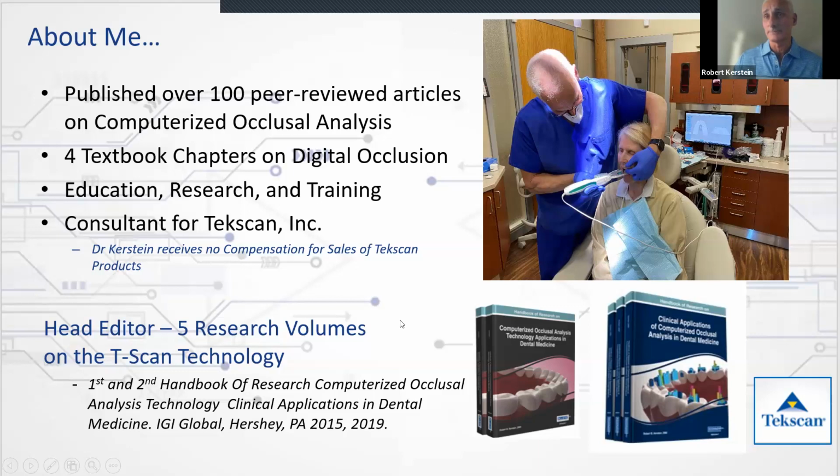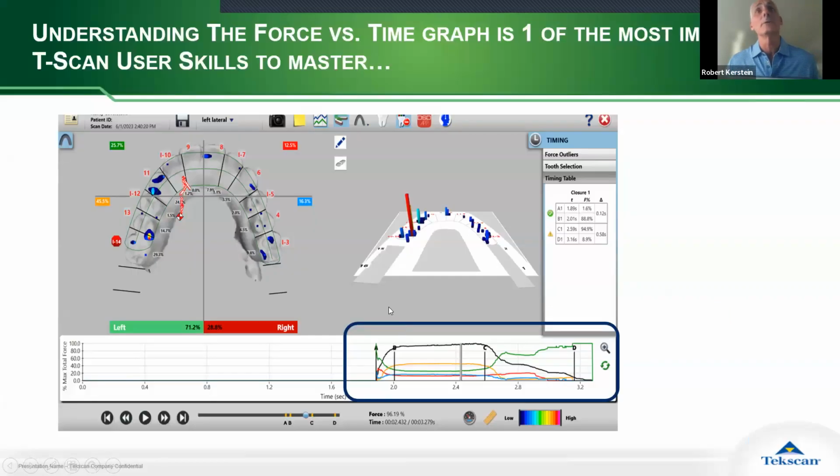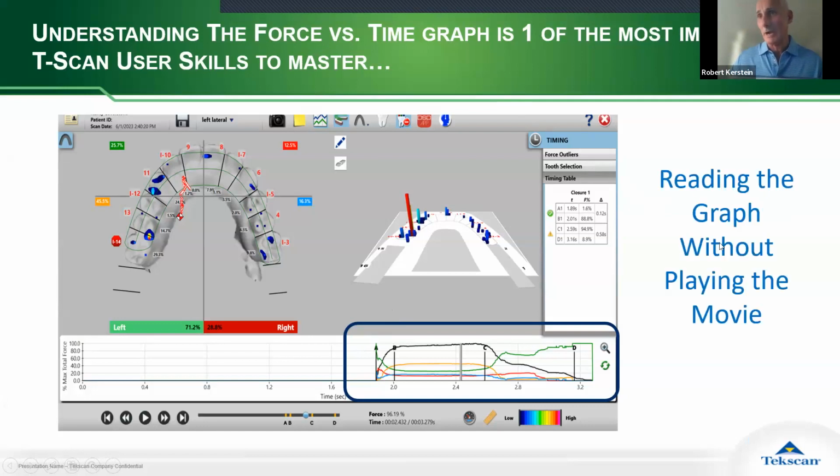Okay, the force versus time graph. As I said earlier, it's one of the most important TScan user skills to master. And to reiterate, you want to learn as a TScan user to read the graph without playing the movie. So in other words, you'd be looking at this and you would understand what it all means.